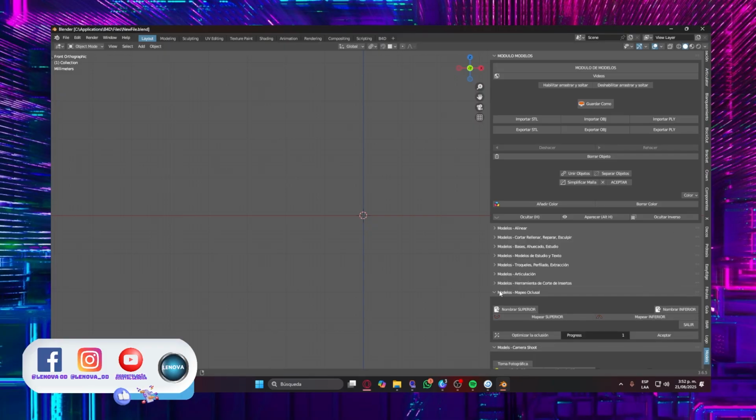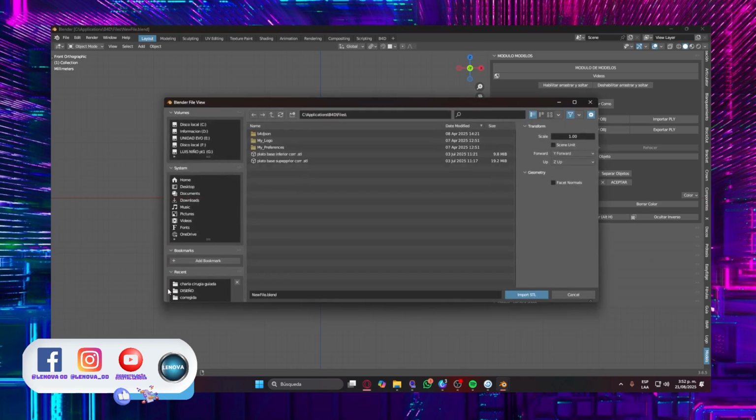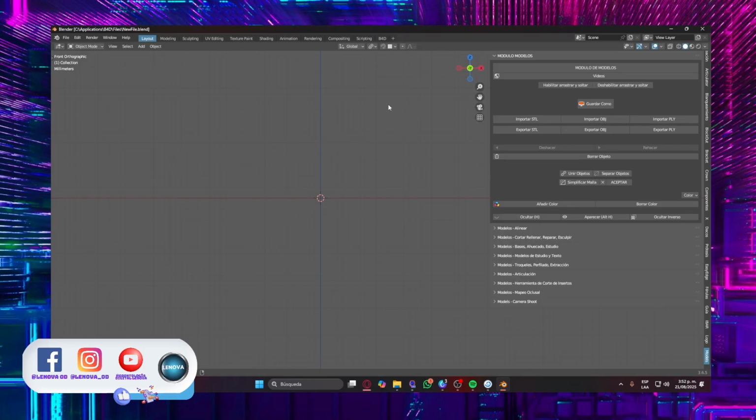So I will start importing everything. The file is imported as STL. I paste the address up here, press enter, and I automatically reach the patient's folder, select the file, and import. It's like a sequence just to bring up the interface. Here, there is no order of whether this is the upper or lower jaw, right?